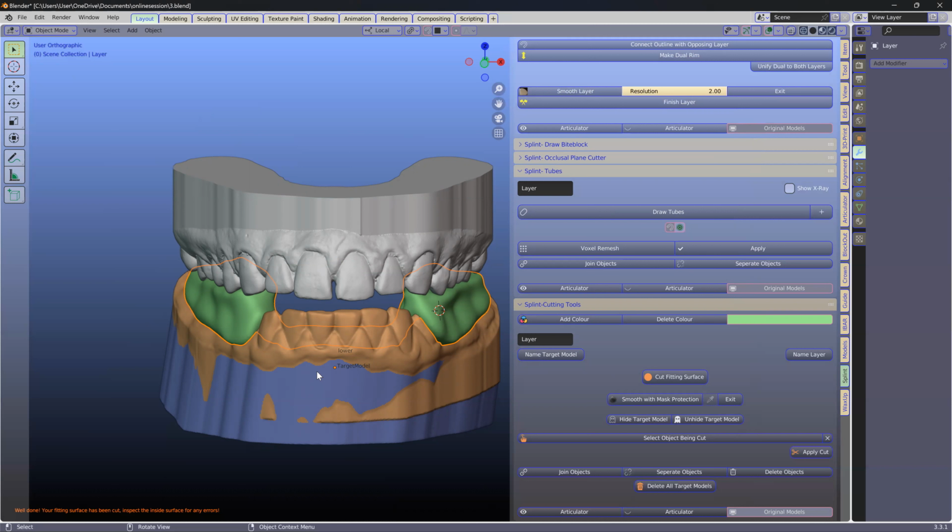And I probably need, maybe later today or tomorrow, I'll put those little increments into the articulator so we can set it. What did you say? Was it 1.75 or 1.25? I just want to double check. The jaw will be like this, I want the bottom to go down and then forward. So it's like that, good.